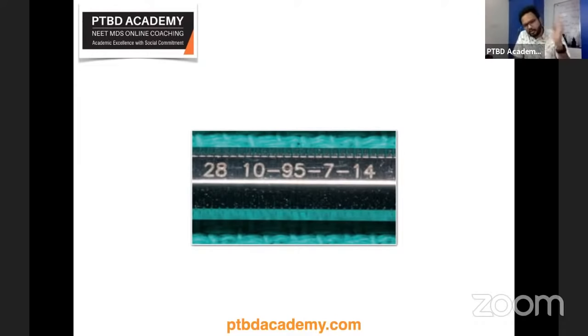Very good. Yes, the left arrow, the previous one, was the primary cutting edge; the top and bottom arrows, the sides, are the secondary cutting edge. And some of you are saying it's a mesial or distal GMT. Are you sure it's mesial GMT? Okay, very good. So first of all, it's a GMT. For a GMT, we have left and right sides, and also mesial and distal sides. So is it mesial or distal?